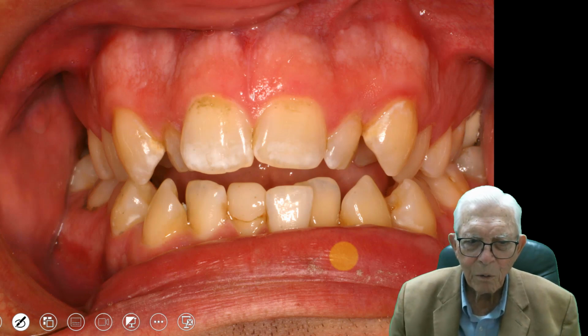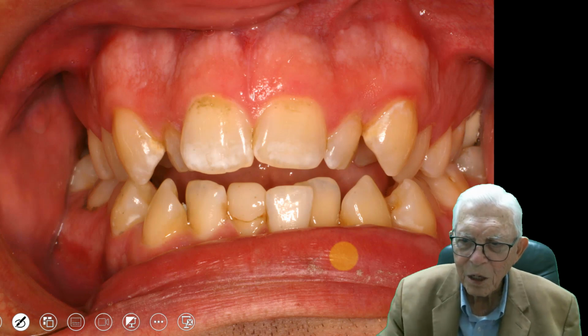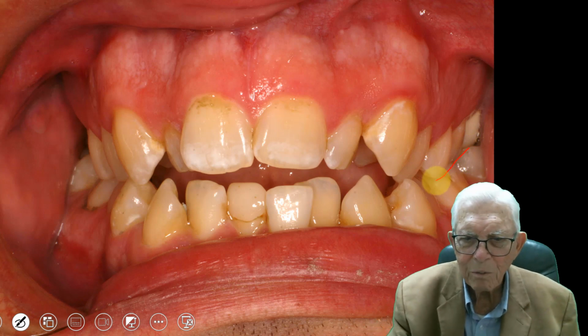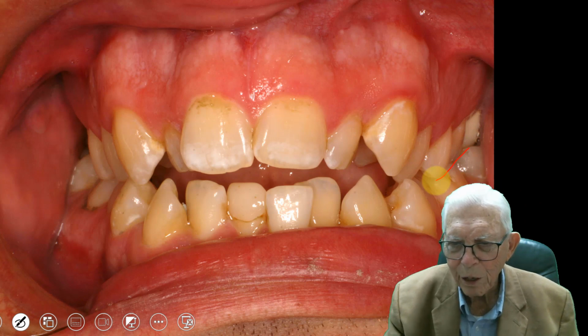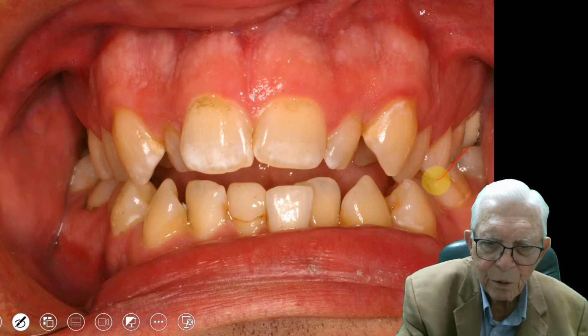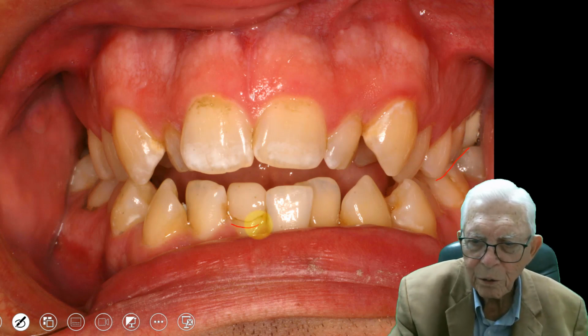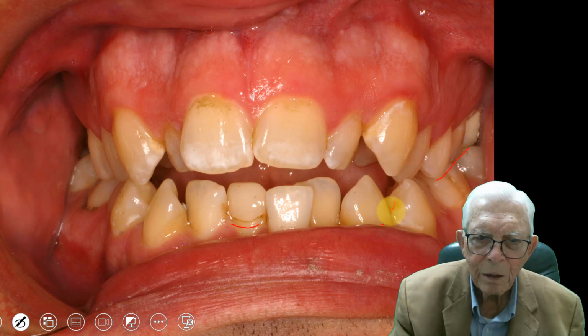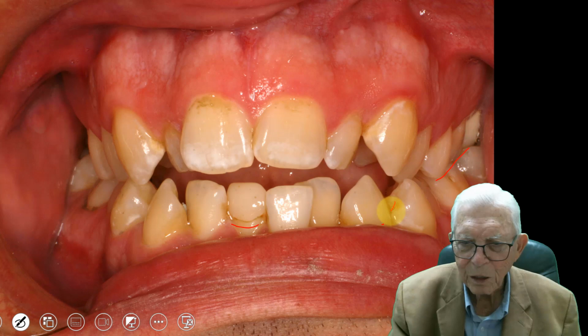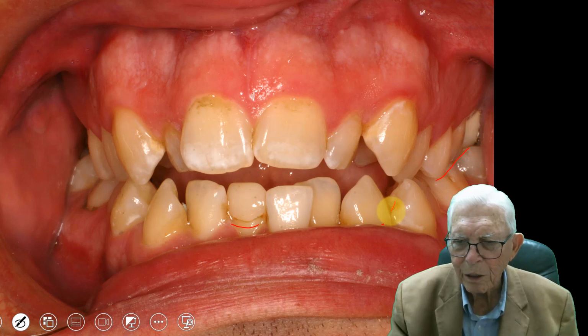Now here we look at the models. The teeth are hitting cusp to cusp. Now what creates that in an adult, or created while he was growing up, you see? And he's got a little defects, see the enamel on the tooth is kind of messed up here. That happens on some people having a sick spell when they're young like this.